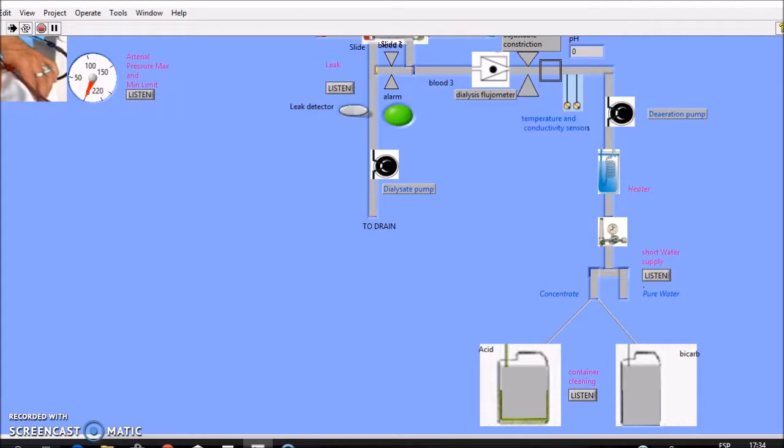Correct the trouble. Concentrate containers. The containers used for the bicarbonate concentrate should be disinfected once a week. Dilute chlorine 1 to 100 to be used for this purpose. After disinfection, rinse a bottle with treated water.